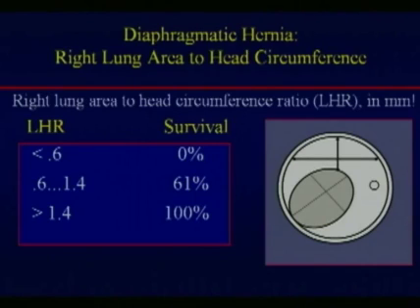And we're looking at the contralateral lung volume because on the side of the defect, typically the left side, we really don't see the lung at all. It gets completely obliterated. So what we simply try to do is look at the contralateral lung volume, which is typically, again, the right side. Even though it seems fairly simplistic and it's only on a single plane, it actually correlates very well, not only with lung volumes, but also, most importantly, with outcomes.